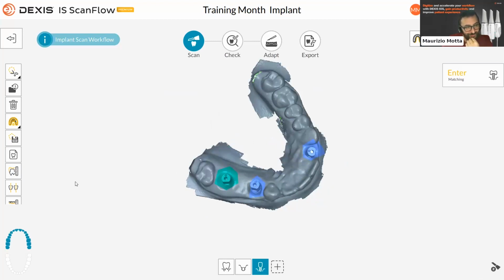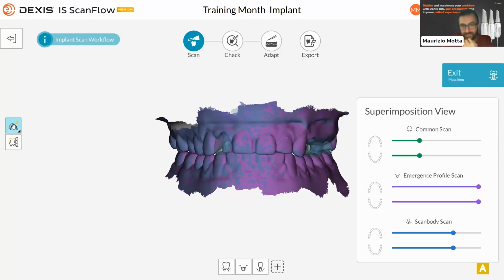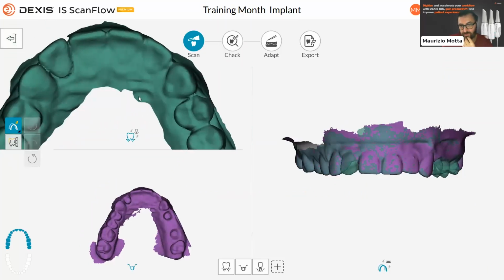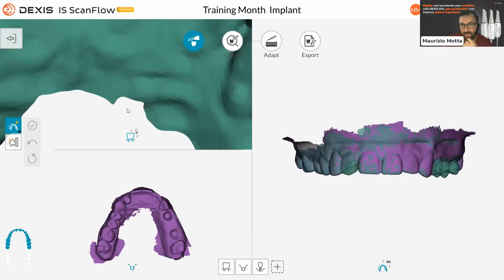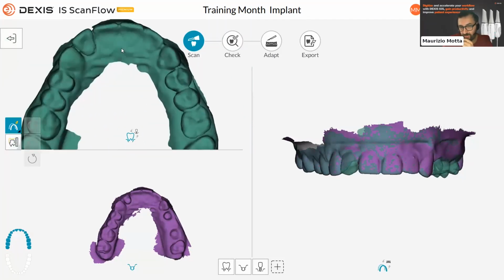So yes, you can zoom the tools to mark the point. You can actually zoom and move. With the wheel of your mouse, you can zoom. Pressing the left, you can move it.